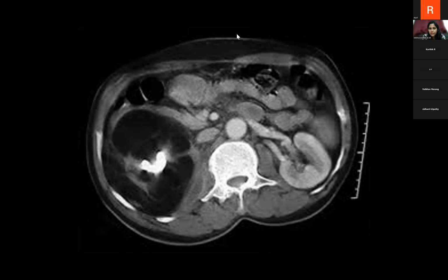No, there's no papillary necrosis in that patient. And someone had typed retrocaval ureter for the previous patient, previous slide. Now I think that doubt is cleared why that is not retrocaval ureter.